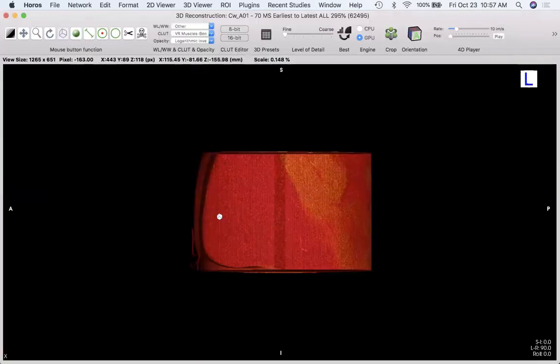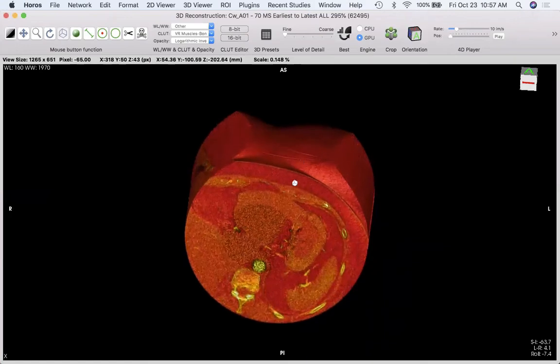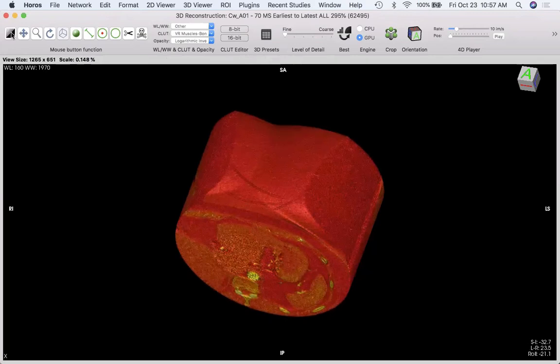And then I'll read those in. Okay, so here you can see the whole volume that's included in our data. These buttons allow you different controls to look at this volume. And so the first one we're going to look at is this button. So a single click on it.